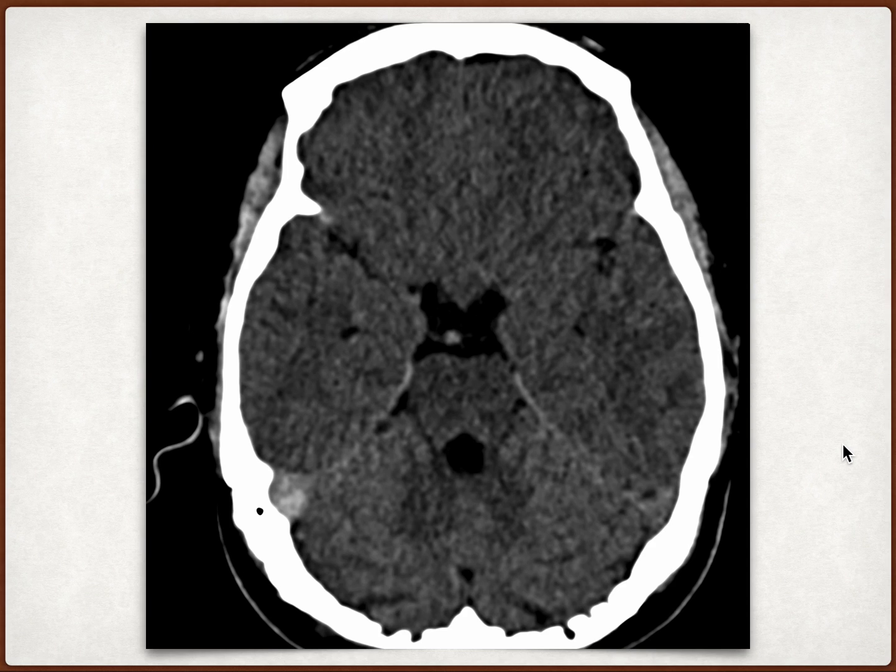Always look for the sinuses and their density and compare with the other sinus density as well.